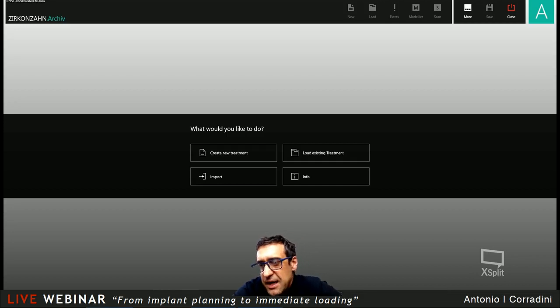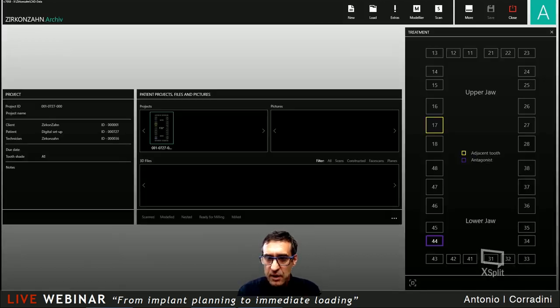So we can start for this kind of cases. We can start from the archive, or we can have a look also inside into the implant planner. We can have a look also about the combined data we have. That's let's say the starting point. So we can start both together. But first of all, we will create a setup. So, but basically the setup or the setups, this case.